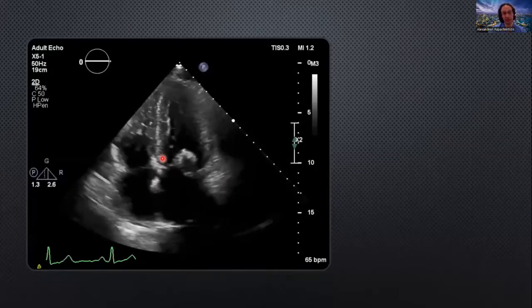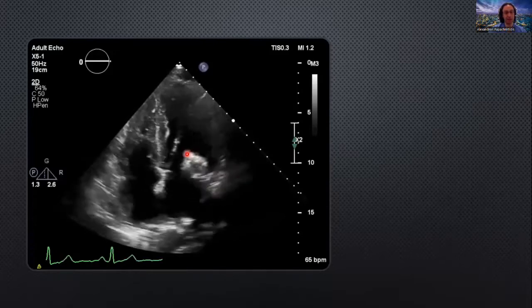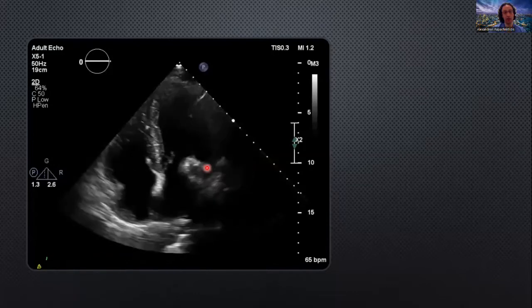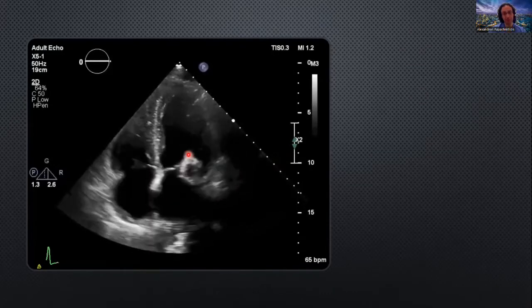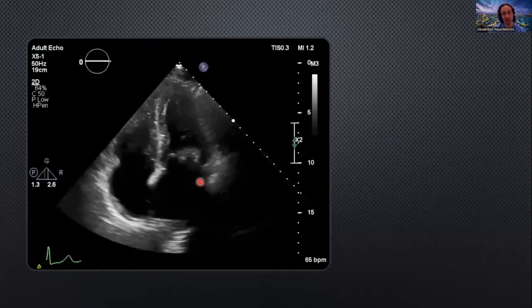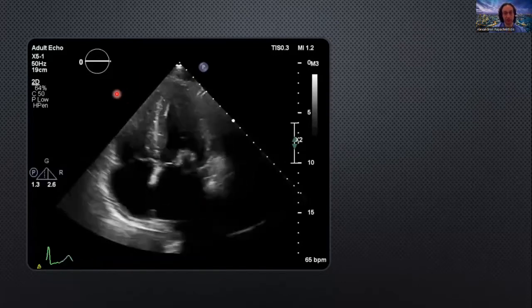Pretty much everybody is familiar with this entity, which is what we call the mitral annular calcification. There are three typical features on echo. We have the core, which is dark, and usually doesn't have acoustic shadowing. That's why you can see the capsule even at the side of the left atrium. There's not much shadowing from the calcification there.